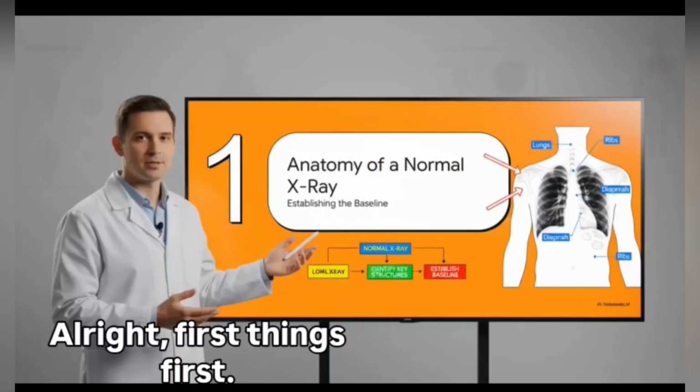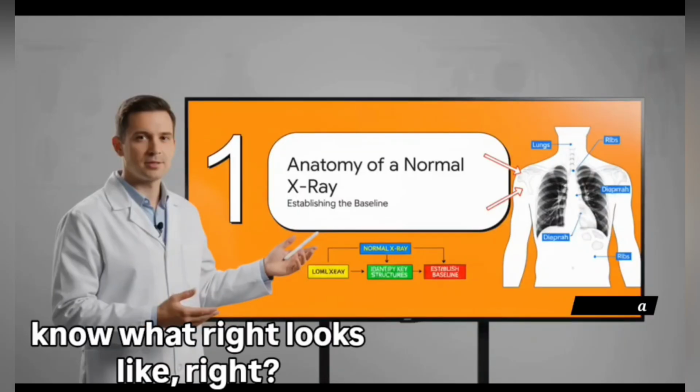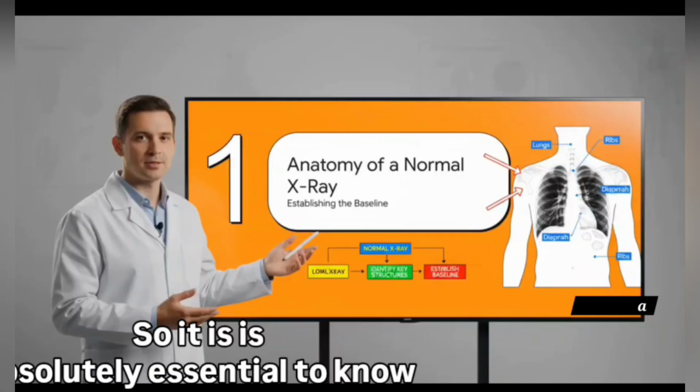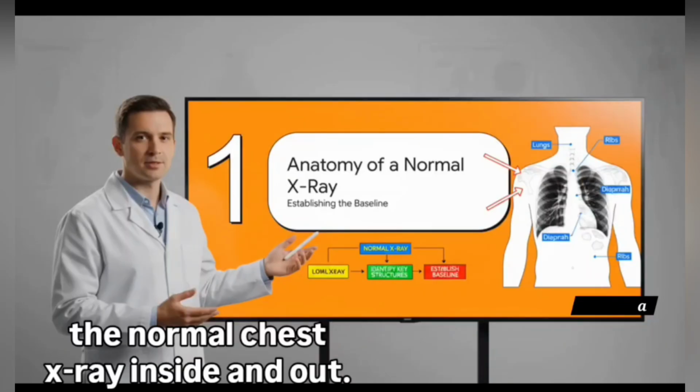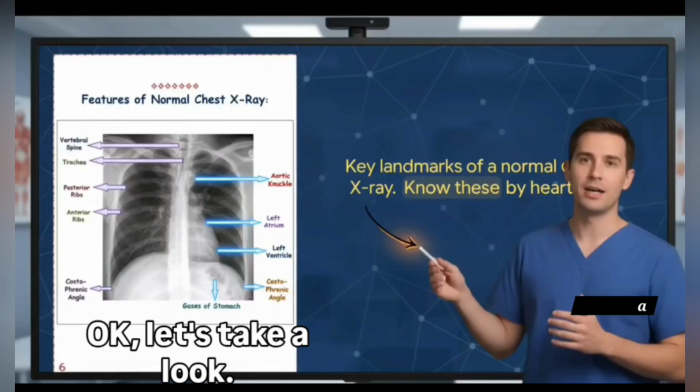All right, first things first. You can't spot what's wrong if you don't know what right looks like, right? So it is absolutely essential to know the normal chest x-ray inside and out. This is our baseline. Okay, let's take a look.